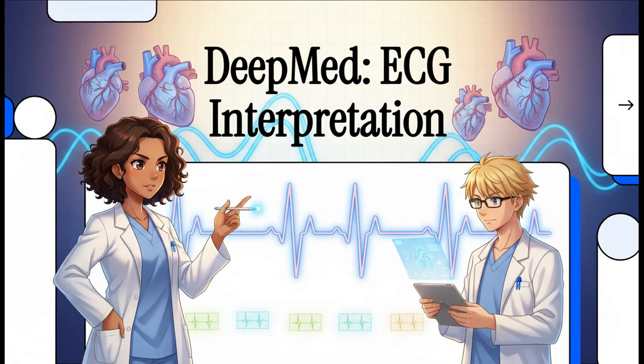You know, the ECG, it's like the heart's own language, right? But let's be honest, under pressure, it can feel like trying to read ancient hieroglyphs. Well, today, we're going to change that. I'm going to give you a foolproof, systematic way to read any ECG you come across. This is going to be your secret weapon for the wards and especially for your final exams. So let's dive right in.